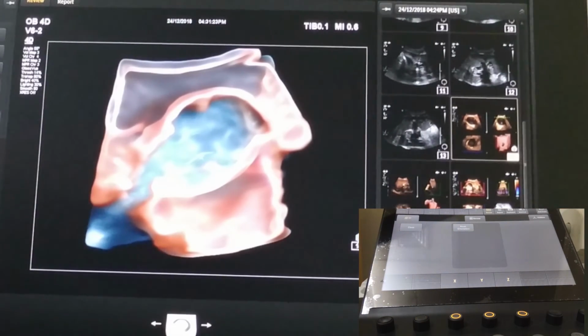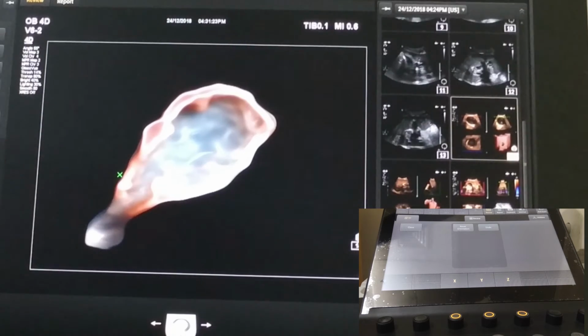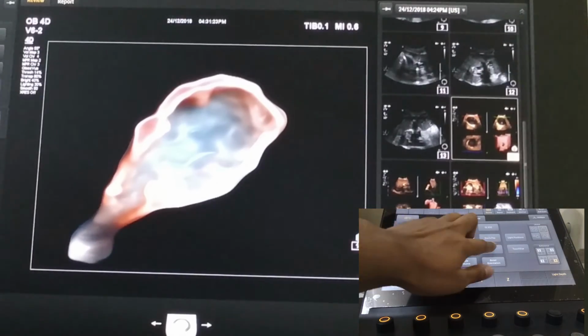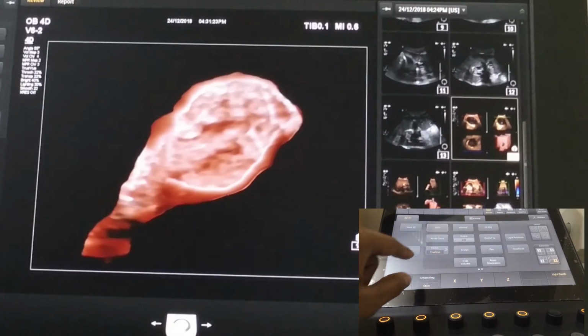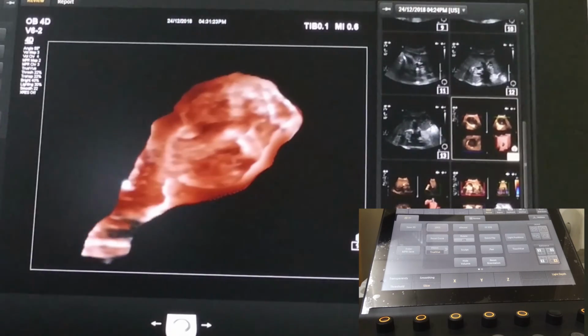Now I will cut the borders by the sculpt option. I'll just keep the structure I want to see on the display. We'll remove the rest. Now I'm zooming the image to fit the screen and moving the image through the pan option. Now a slight rotation. TrueView again. And changing the light source for a better view.